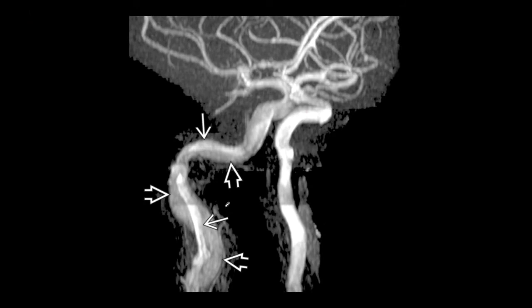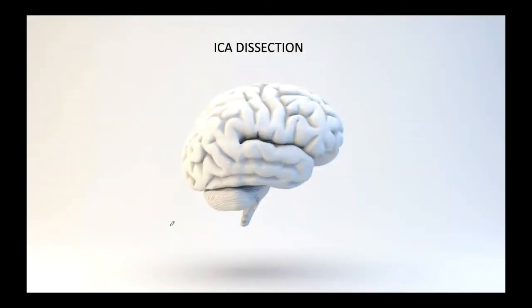And this is what I got in an MRA. So here on one side, you really get a uniform flowing artery with similar signal, but here you do see differential signal. So that which is hyper is usually associated with flow in the true lumen, and this would be the false lumen. So when you have two lumens, then the diagnosis is going to be dissection. So dissection you can see in a regular MRI brain. Check your T1 sequences.